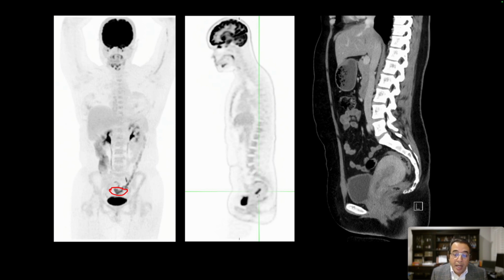And we find that on the sagittal image, here's the uptake in the endometrium, and it corresponds very well to the endometrium seen on the contrast enhanced CT that this patient had, also on this sagittal image in the retroverted uterus. And so remember that endometrial uptake in young patients can be physiologic and should not raise a suspicion of malignancy. If this was a postmenopausal woman, this endometrium would qualify as thickened endometrium, and focal FDG uptake in that situation would definitely be abnormal, needing further evaluation.